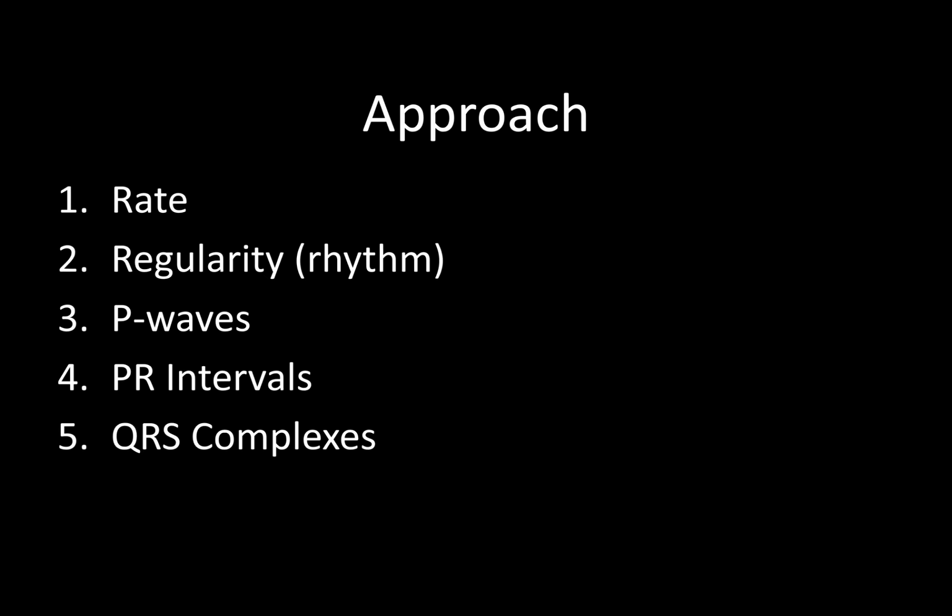So, rate, what are we looking for? Well, we're looking to see if it's normal, fast, or slow, right? And so normal being 60 to 100 beats per minute, right?